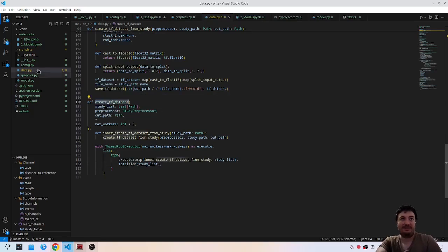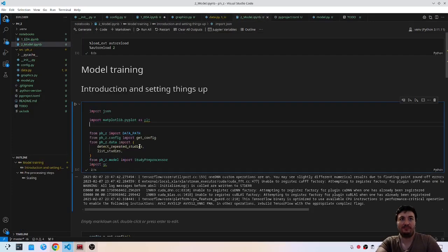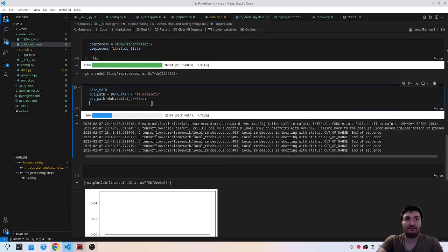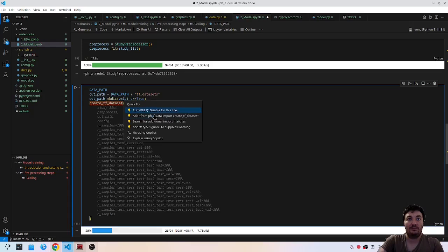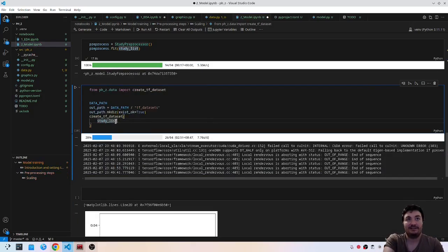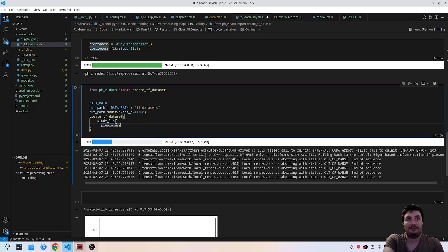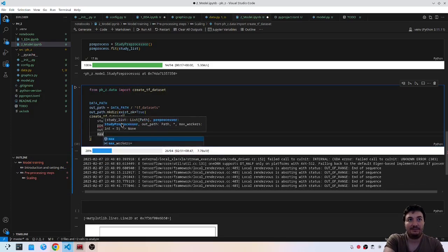What happens if I do this? It went crazy. Study list, preprocessor, out path, max workers 5.